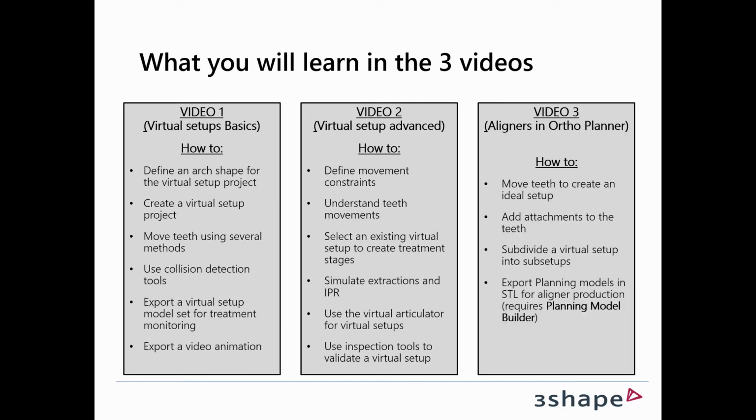And then the final video is more focused on creating aligners in the Ortho Planner module. That will teach you how to move teeth to create an ideal setup, how to add attachments to the teeth, how to do subdivides in a virtual setup into sub-setups, and how to export the planning models in STL for aligner production. And as I said, that requires the Planning Model Builder.